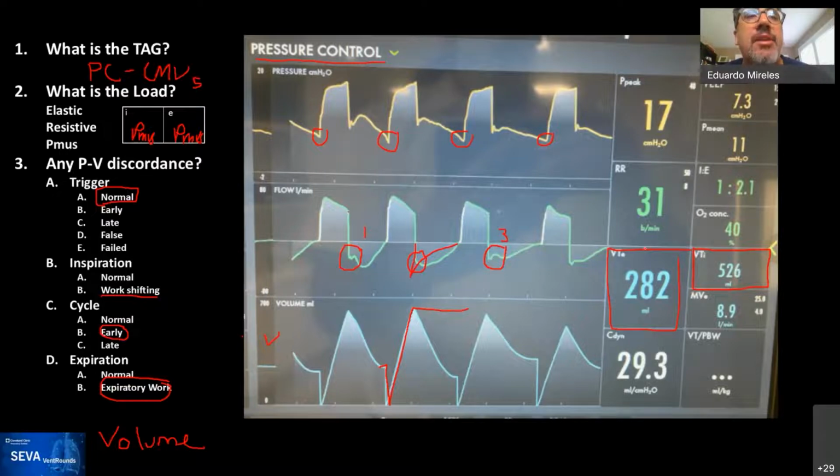Rob, any comments about volume control versus pressure control? No, I think volume control would be a disaster in this situation. And for neonates, we used to always use high frequency because it decreased the amount of leak going out through a BPF. And the other interesting thing is, the gas that comes out of the lungs as leak volume probably carries some CO2. It probably contributes to ventilation.